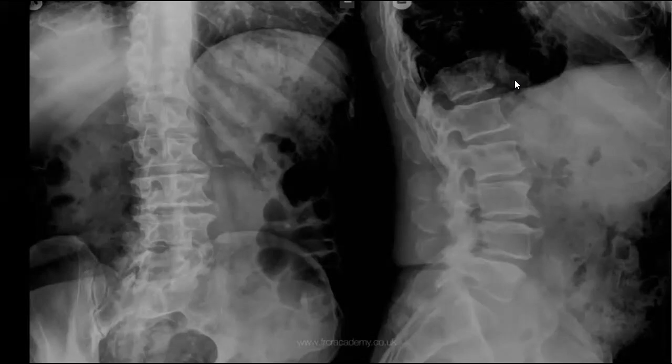You remember the curvilinear shadow when I talked with you, that when you find the curvilinear shadow, yes, exactly, the abdominal aortic aneurysm.